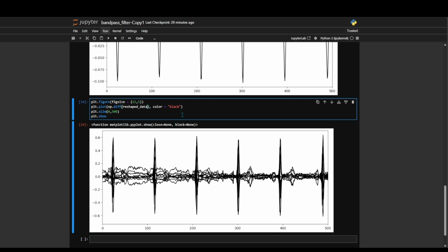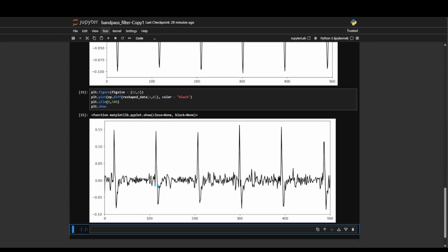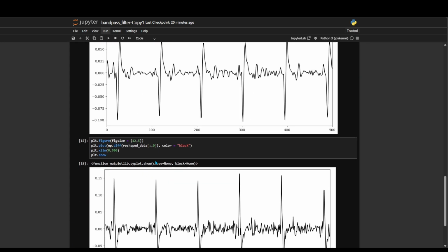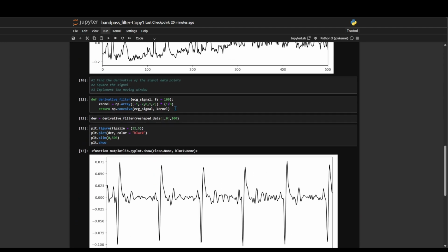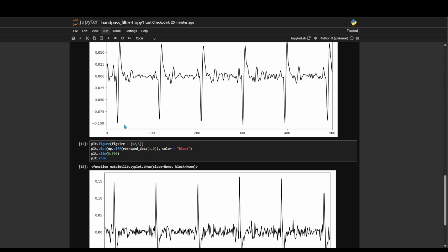Oops. Now you see the result is pretty similar, but now there's no reverse effect. But I think it's still okay to use both of them. It's just you have more control over this function. But either way should be fine.